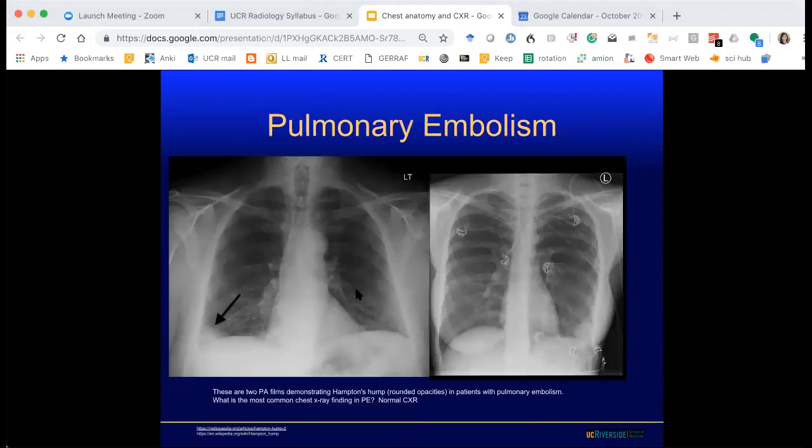So here the patient, look at the rib, the diaphragms. Normally it looks a little bit more concave. Like here, for example, right? So this one is a nice full inspiration. This patient is not taking a full breath because here the costophrenic angles go all the way down here. So it's a combination of qualitative and quantitative.